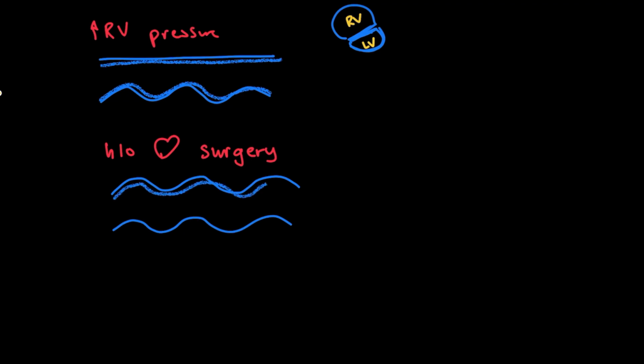So we'll add in some thickness here. Instead of in systole both contracting together nicely, the heart's swinging, and your septum actually moves up and away during systole, and then they move down together in diastole, systole, diastole, systole.